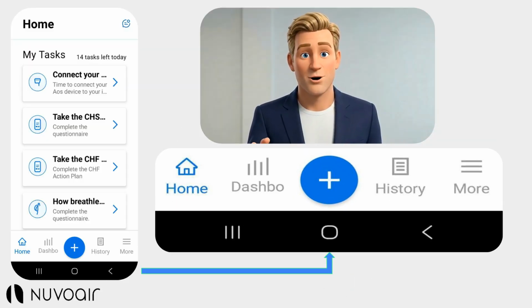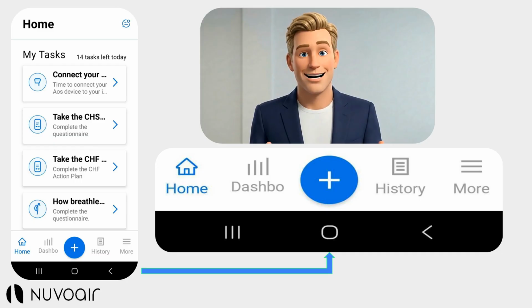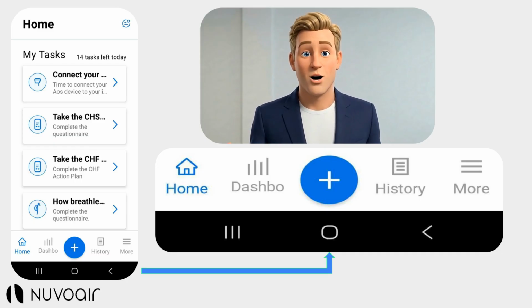Hi there, I'm Chris, and I will show you around the NuvoAir Home app. It is really fun, and the best part is that if you need to come back and watch this later, I will be here to go back over it with you.